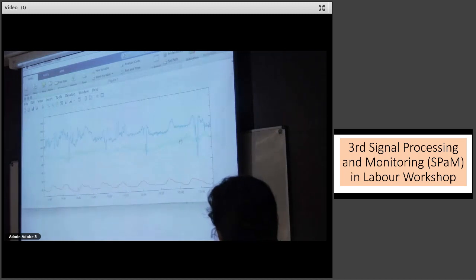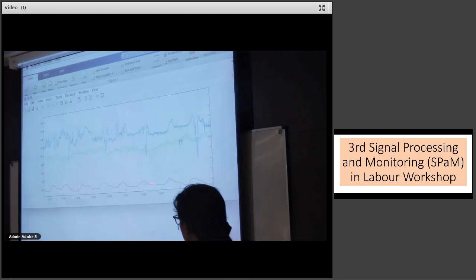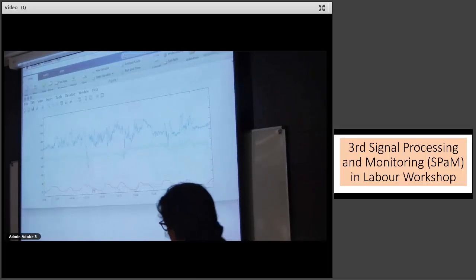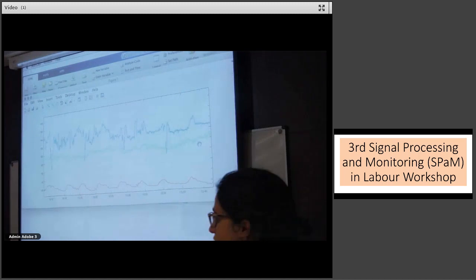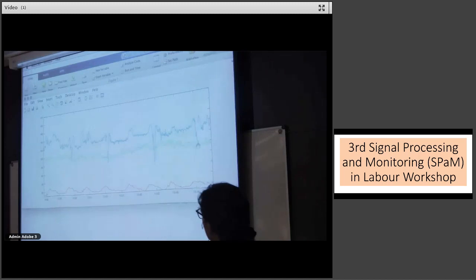So what you want to say is the reason is the time between them. The number is that, but they're wide. Is that what you're saying? Yeah, the time between. Just stop at any one of them and you'll see what I mean. Right there is the point I'm trying to make, that it comes down immediately. So maybe uterine contractions are actually increasing in frequency. Probably hypertonus. Okay. All right.